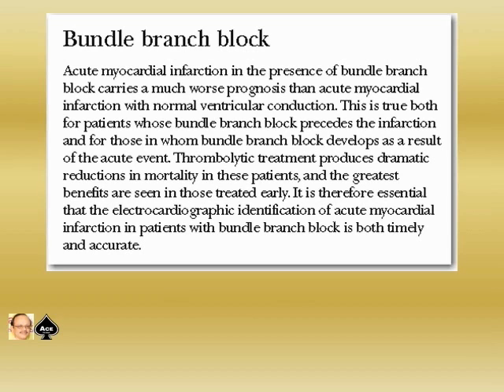Thrombolytic treatment produces dramatic reduction in mortality in these patients, and the greatest benefits are seen in those treated early. It is therefore essential that the ECG identification of acute myocardial infarction in patients with bundle branch block is both timely and accurate.